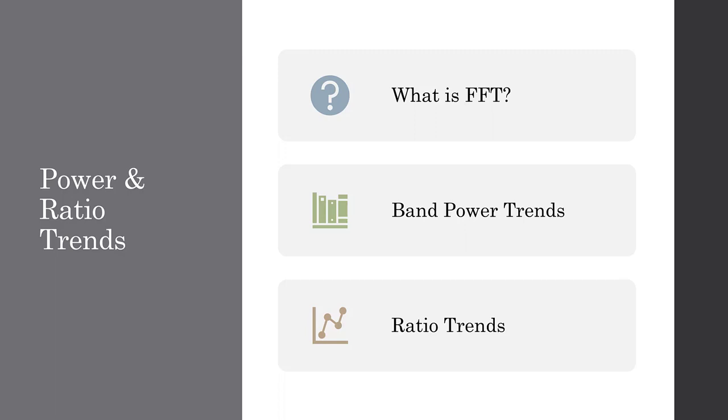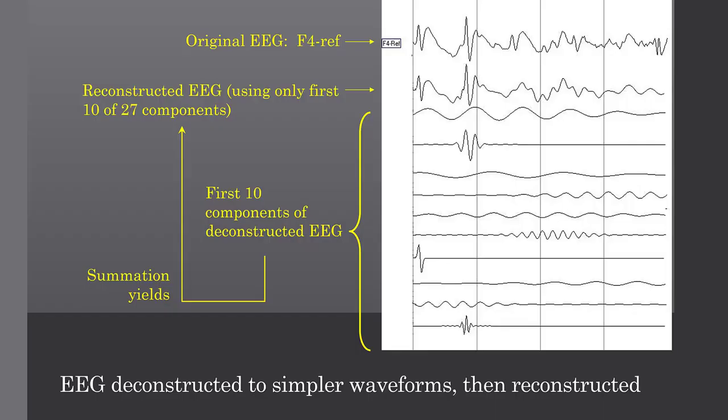What is it doing? This will be a very brief overview. There's some really fantastic material on YouTube that goes into the details of how the most famous algorithm in the world, the fast Fourier transform, has an interesting history, and a reason for why it's called the fast Fourier transform as opposed to the Fourier transform. We won't dig into the details of that. Let's just see what it's doing.